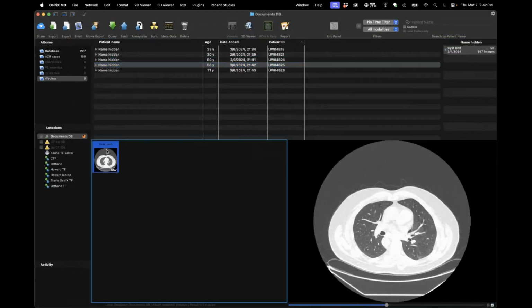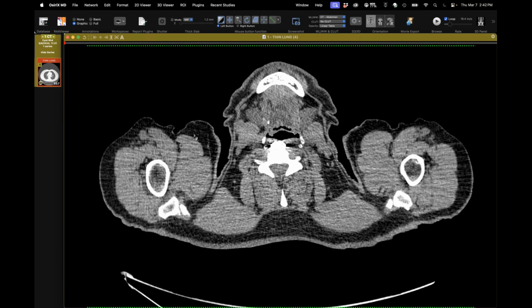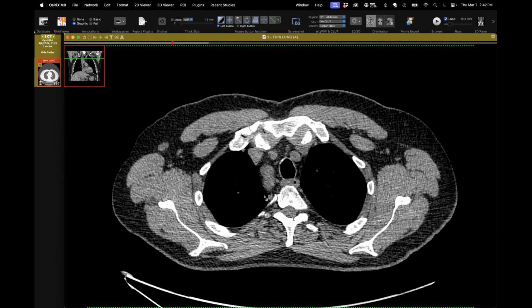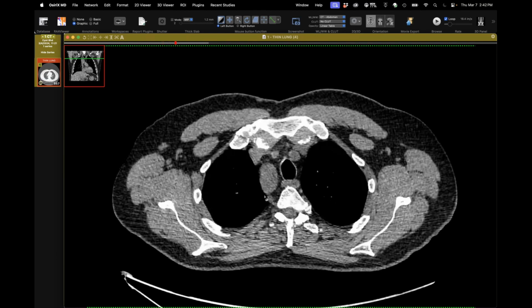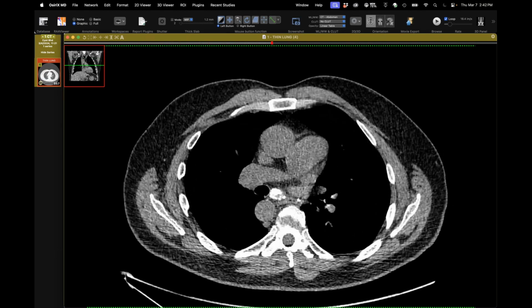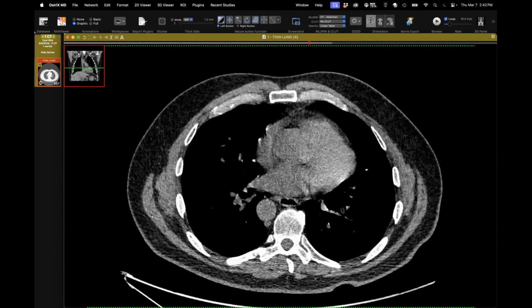One of my senior residents made a great call in this case. So this was just follow-up for metastatic renal cell cancer, and we see a lot of these. And it's got a couple fun findings. First, it's got a right aortic arch with the flavor of mirror image branching. It's not a double arch with an atretic segment. No congenital heart disease, no history of congenital heart disease. It descends on the right, does all the things it's supposed to do. It's got old histoplasmosis, usual stuff.